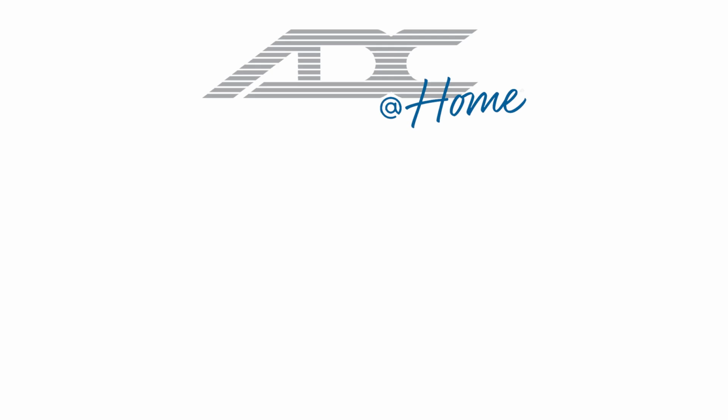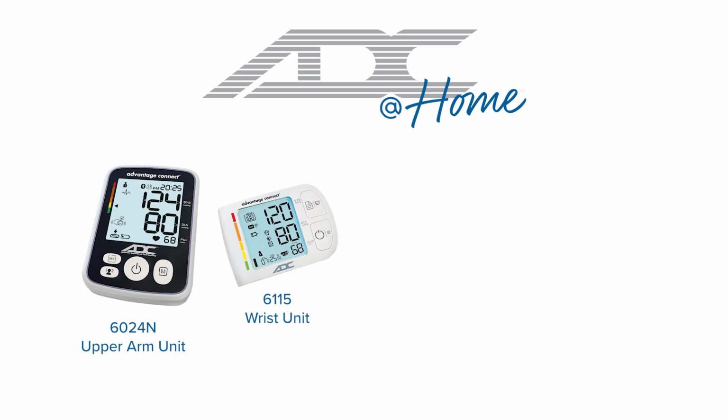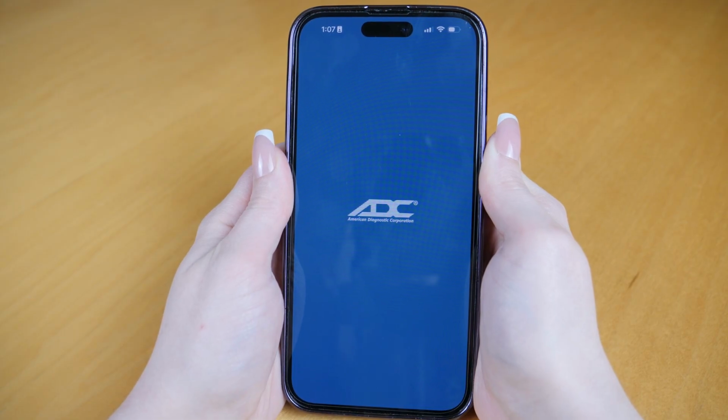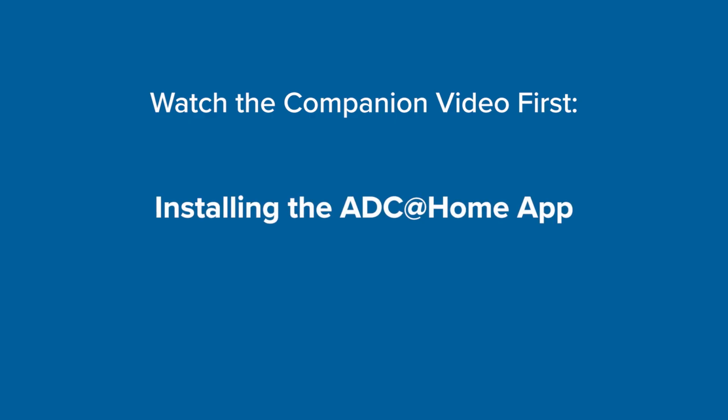The Advantage Connect 6024N and 6115 can be paired with a smartphone or tablet using a Bluetooth connection and our free ADC Home App. If you haven't already downloaded the app and paired your monitor, check out our companion video, Installing the ADC Home App.